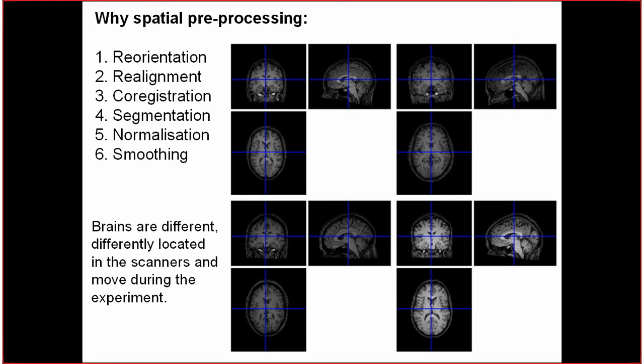It's a very hard task, and in order to do it, you will have to normalize all the individual samples to a standard canonical template, which is mostly done by segmentation and normalization.